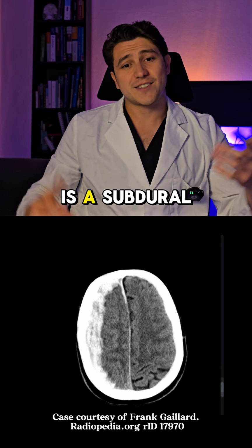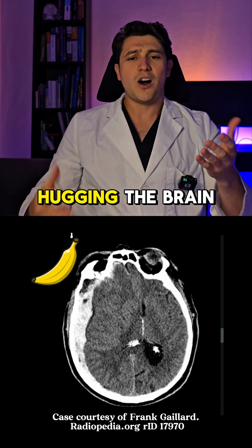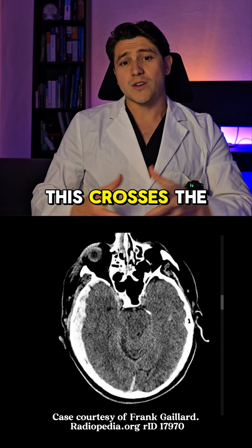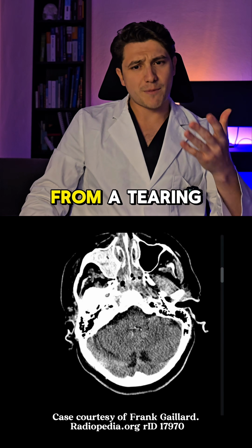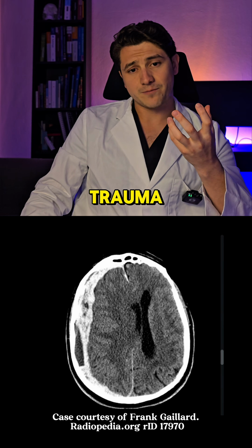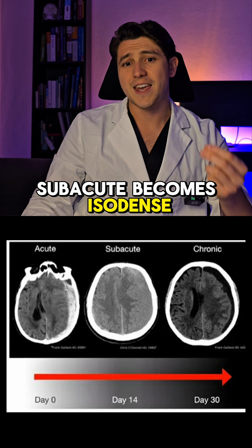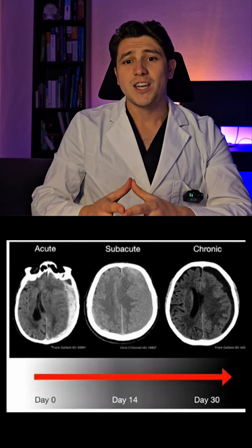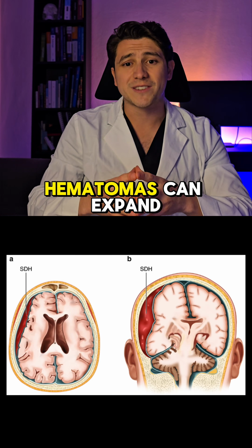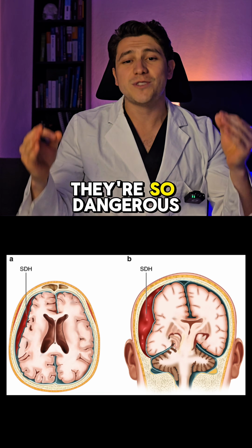The second one is a subdural hematoma. This is a classic crescent-shaped collection hugging the brain hemisphere. This crosses the suture and it results from a tearing of the bridging veins, often after rotational trauma. On CT, acute subdurals are bright, subacute becomes isodense, and chronic turns dark. In older patients with atrophy, subdural hematomas can expand silently until they are huge, so that's why they're so dangerous.